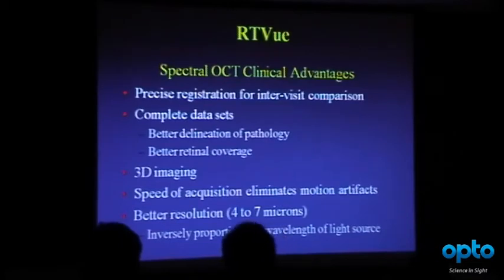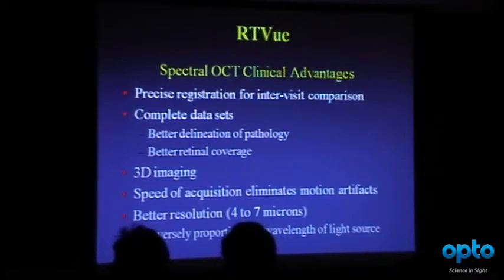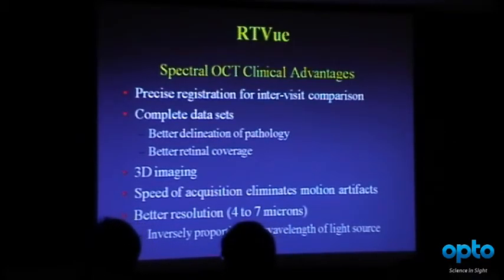So how does this translate to better patient care? What are the clinical advantages? We can now precisely register one OCT from one visit to an OCT to a future visit. So you can know that you're always imaging the same place from visit to visit.